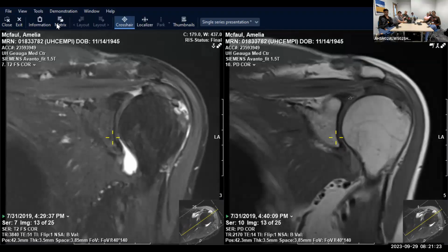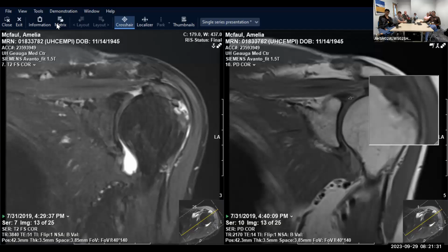And we can see that the footprint here is relatively empty. If we were to zoom here, you can see this is the subchondral bone plate or the subinsertional bone plate here, this low signal intensity line. You don't see it as much here, but we see fluid where there should be tendon. So this is a probably high grade articular surface tear because I'm hallucinating that maybe this is one very thin fiber here remaining. It's probably for all intents and purposes full thickness with one thready fiber remaining intact, which is preventing complete retraction of this whole situation.